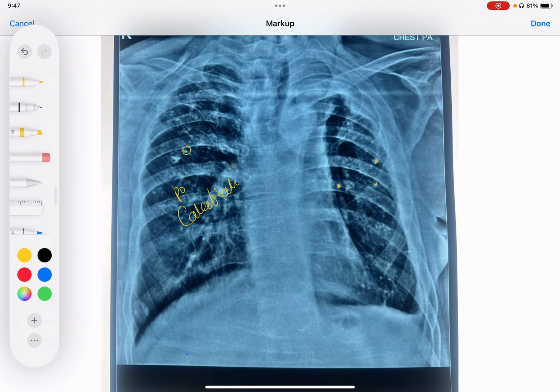X-ray. So this patient actually had a history of tuberculosis and he had completed tuberculosis treatment 3 years back, and this is supported by the presence of fibrosis in the left lung field with tracheal shift, mediastinal shift, and multiple calcifications in bilateral lung fields, which is very characteristic of an old recovered infection.